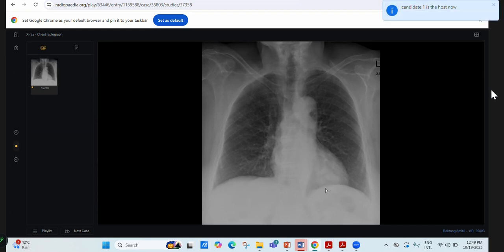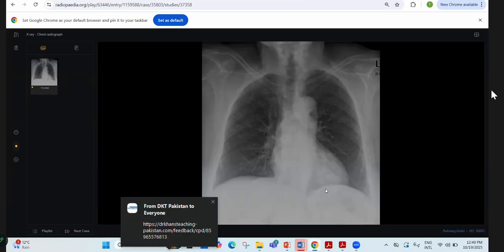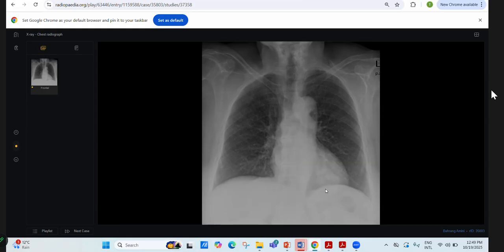You're right, but even if you are giving a solitary pulmonary nodule, always keep an eye out, or make a habit of putting more differentials. And it's no problem in saying that it looks like a mass, but if there is an examiner who doesn't want to discuss it further, he could just change the film, or pass the film, without leading to your final diagnosis. It is a pulmonary AVM, and the rest of the questions you already mentioned, its association and everything.